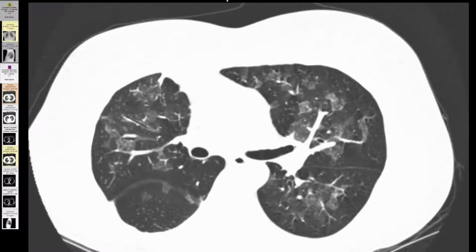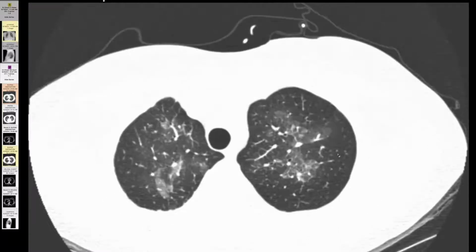So this one has really a pretty severe case of bronchiolitis obliterans syndrome, or really constrictive bronchiolitis from graft versus host disease. So this is more dramatic cases of this condition. Generally, in stem cell transplantation, the degree of constrictive bronchiolitis is not as impressive as it is after lung transplantation. But here's a case where it's pretty dramatic.